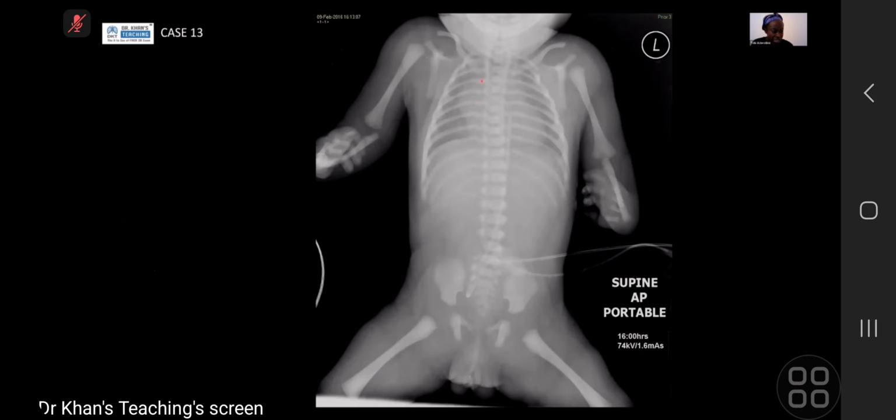Once you identify this on the chest radiograph, what else would you be looking for? So this is a different patient who also has esophageal atresia. Once you've made this diagnosis on your chest radiograph, what else are you going to assess on the radiograph? Is this an infant babygram of an immature infant? I didn't see an ossification center, ossification of the upper limb.